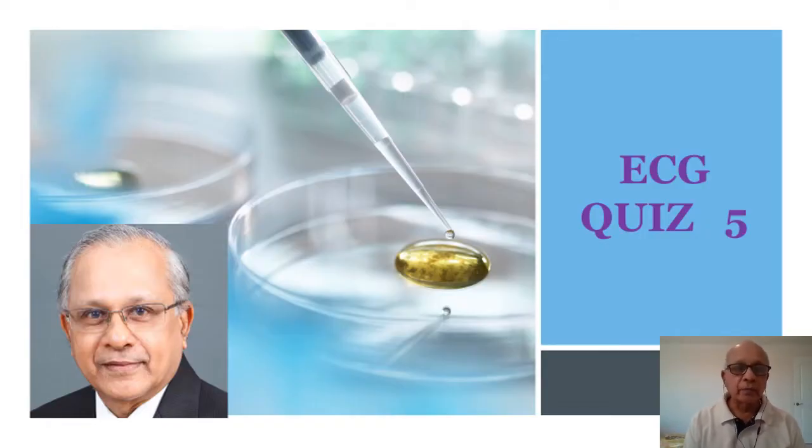Today, friends, I propose to show you two 12-lead ECGs and one arrhythmia. I'm sure you are ready with your pen and paper to get this quiz solved. Here I would like to make one suggestion.